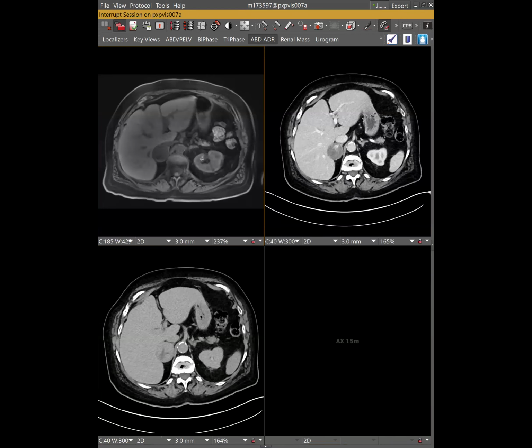Couple of things. One, it must be a really old hematoma, right? Yeah, so actually I had a case just like this, and it had bleeding into it and all the stuff, and the path came back ancient hematoma. I love it. That's awesome. No, literally I learned about this entity, which is that you can get a hematoma that is really old, but that has chronic bleeding within it because it creates these friable vessels that bleed over time.